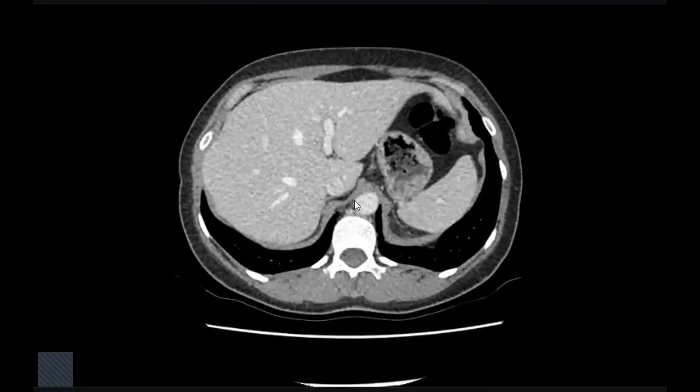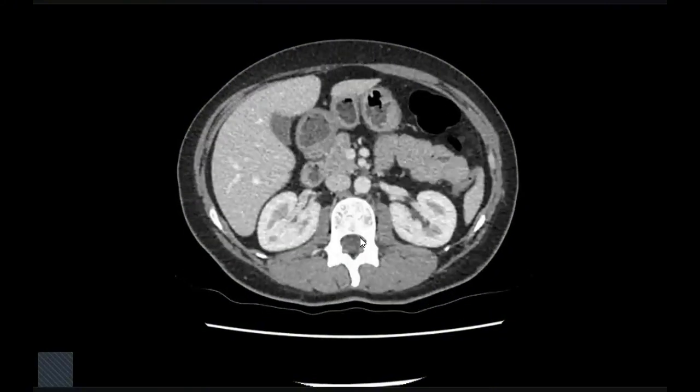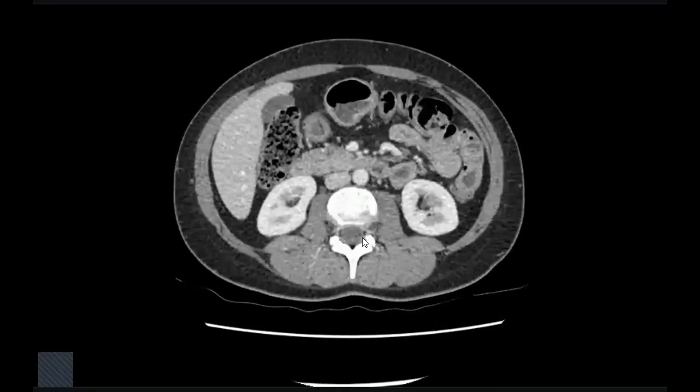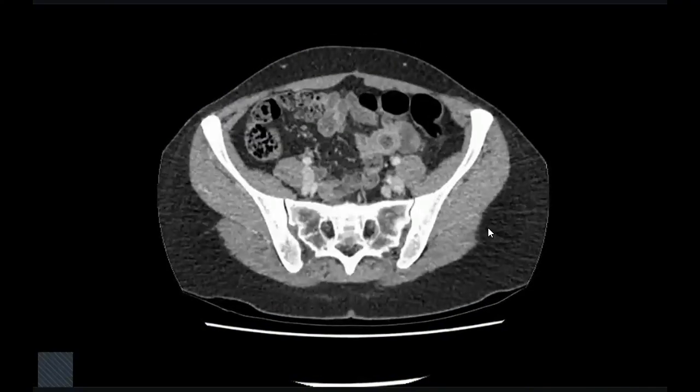By the way, in the exam, you will go here, and the examiner will not give you time to do all this. If you scroll once and go again and you didn't reach the area of interest, he will ask you to look at this region.